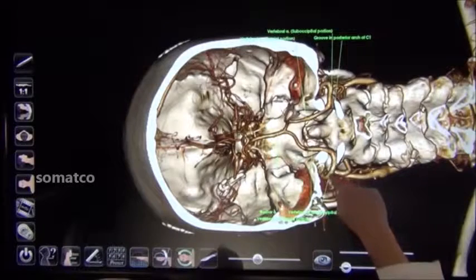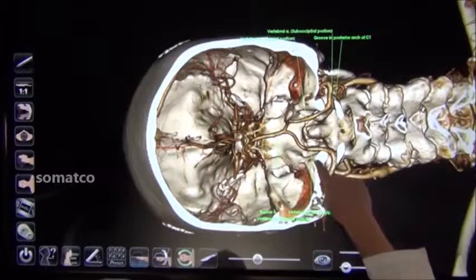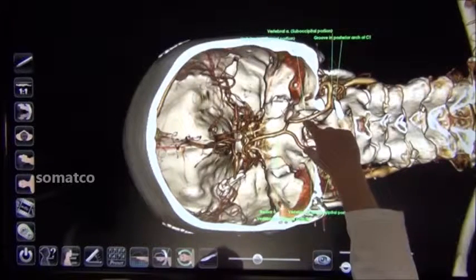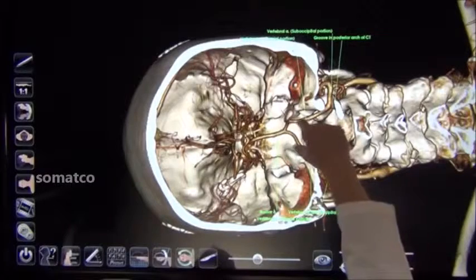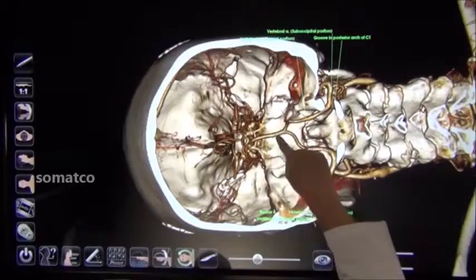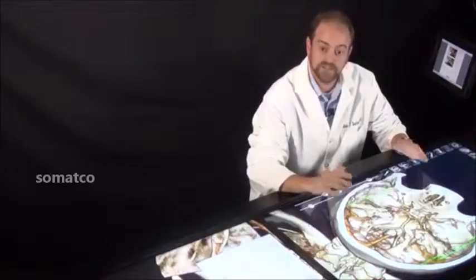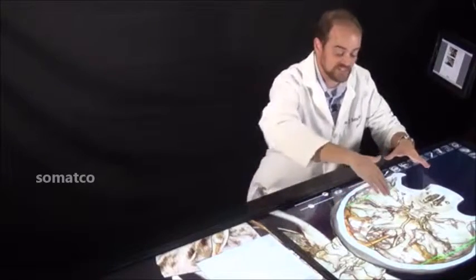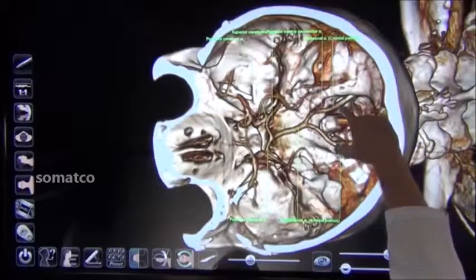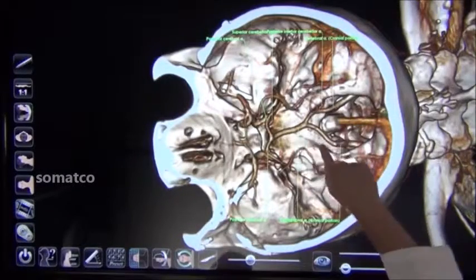As the vertebral artery continues with the suboccipital portion between C1 and the base of the skull, the two vessels now are called the cranial portion. The cranial portion of the vertebral artery will fuse as the basilar artery, a midline vessel ascending towards the circle of Willis. Here, from a superior perspective looking down into the top of the skull at the cranial base, we can see the cranial portions of the vertebral artery clearly forming the basilar artery.